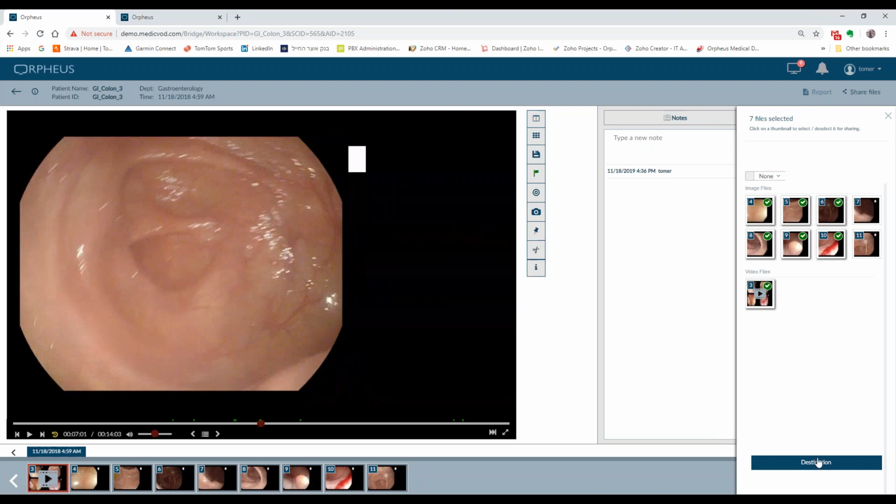Before I go into video editing, just to complete the actions that you will be able to do, as administrators, you will have permissions to both save locally as well as send it to the PACS. So what you will see here is AGFA EI, I believe that's how we labeled it, or AGFA production. And whatever you've selected will be sent in DICOM.